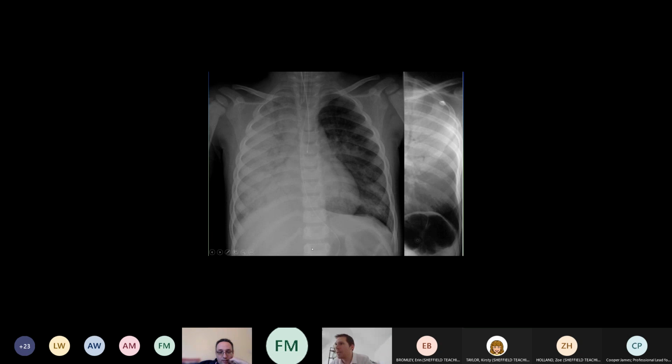Left. I can see a concave line, which is the true left heart border, and then I can see another one that seems to follow it back from that, but I don't know if that means anything. Try and direct my mouse pointer. Am I going that way? Left there. There, I can see an arc. I don't know what that is.